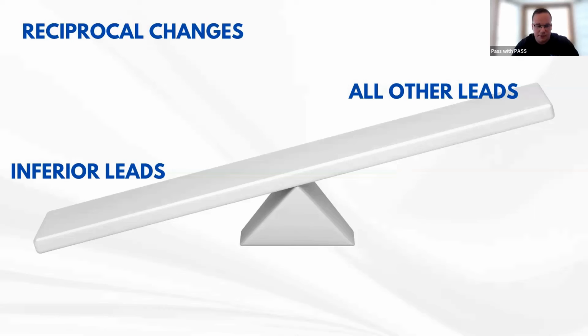It's kind of like the way I always taught it in the paramedic program: I already have a STEMI pattern. I already have ST segment elevation in 2, 3, and AVF. Having reciprocal changes is just extra evidence, right? It's like I already have the crime being committed on camera, and now I have the suspect telling me he did it, right? I don't need him to tell me he did it. I already have it on camera.